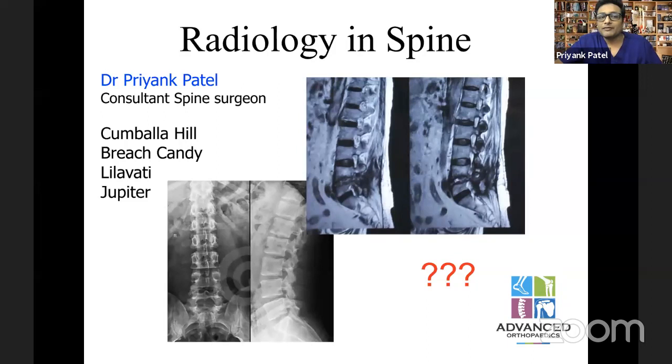What is specific is that in the T2 weighted image, you will see that water is white in color. We know that the canal or the column which holds the CSF has water in it, and that appears white on T2, whereas black on the T1 weighted image. The other thing you see is that bone is basically black in the T2 weighted image, whereas it is grayish in the T1 weighted image. And the third thing you notice is fat, which is white in both T1 and T2.